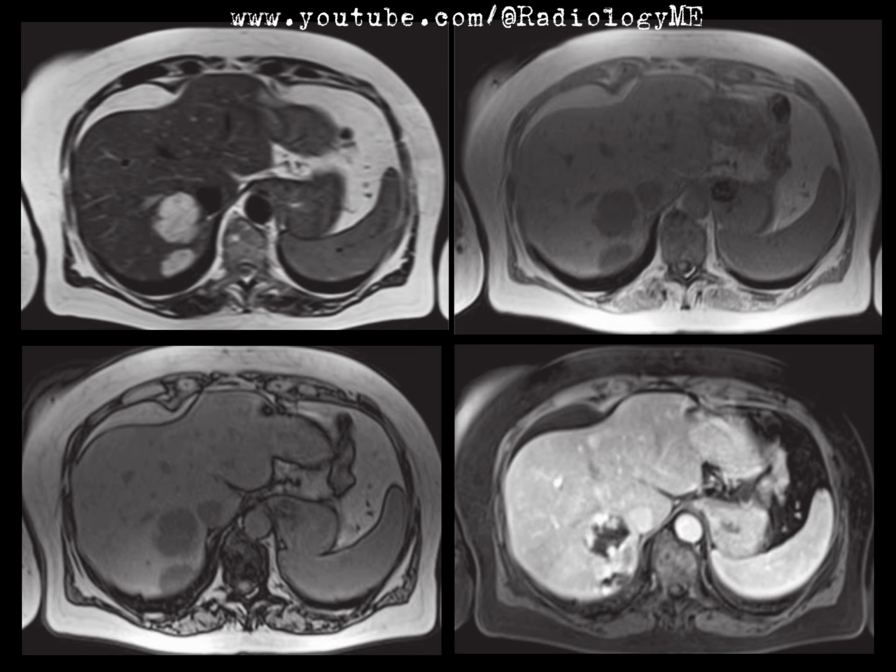Now, in terms of differential diagnosis, we know that cavernous hemangiomas are the most common benign lesions in the liver. They typically have a very characteristic appearance on imaging. But if there's ever any doubt, especially if the lesions don't show the classical imaging features, we may need to consider other diagnoses like focal nodular hyperplasia or even hepatocellular carcinoma, depending on the clinical context.